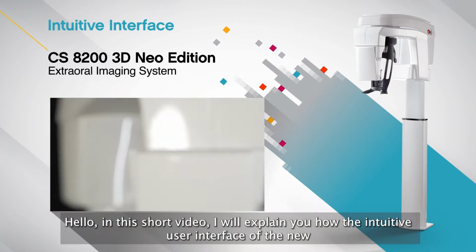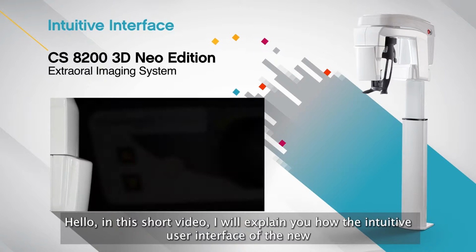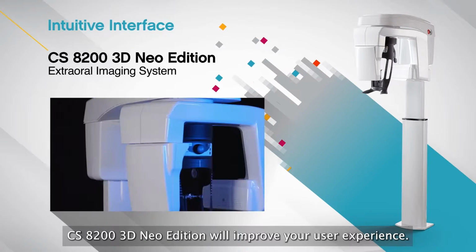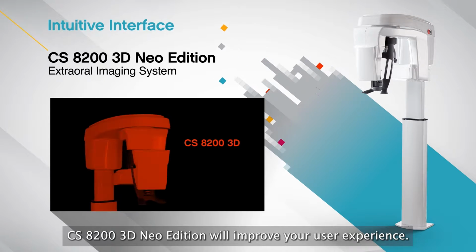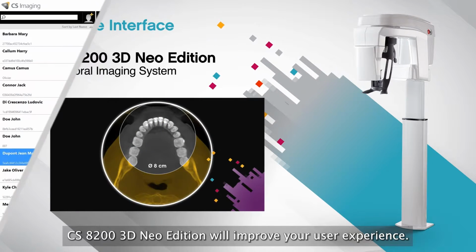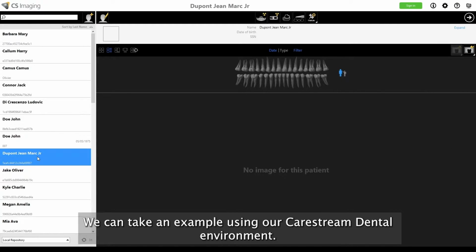Hello. In this short video, I will explain to you how the intuitive user interface of the new CS8200 3D Neo Edition will improve your user experience. We can take an example using our Carestream Dental environment.